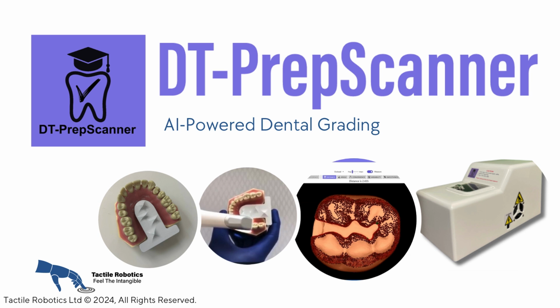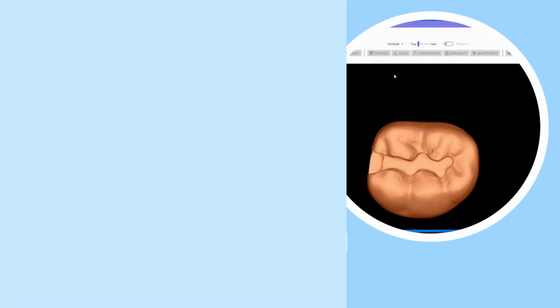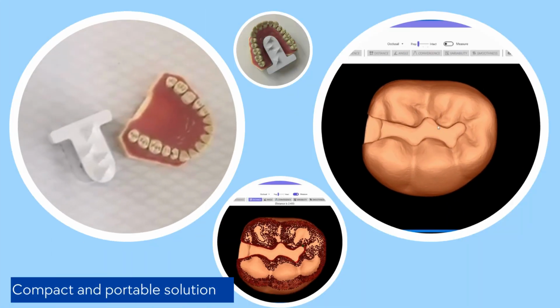Welcome to this demonstration video on PrepScanner technology, which can be linked to your intraoral scanner for prep measurements, grading, and detailed reporting. In this video, we introduce a new technology that offers a fast, objective, and accurate way of grading students' dental prep and enhancing students' preparation.